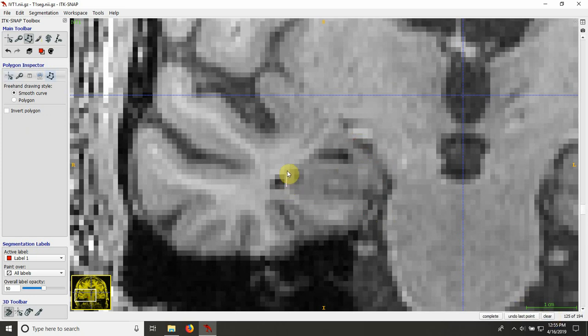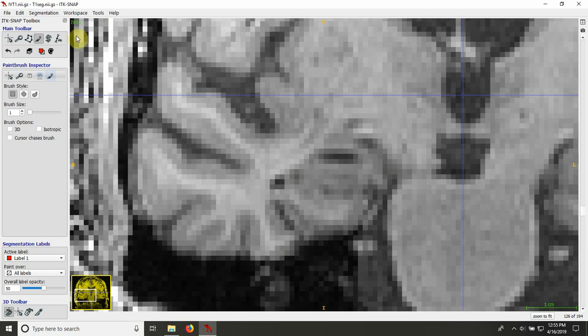So see here the border with the white matter, the border with the CSF, then taking that border that I just pointed out, some darker voxels here, and to the most medial point here, and then the border with the white matter again. I'm going to remove some voxels here which look a little darker and some lighter voxels here. I'm going to go to an anterior slice. So again, I see some darker voxels here and there, so that would be my border.